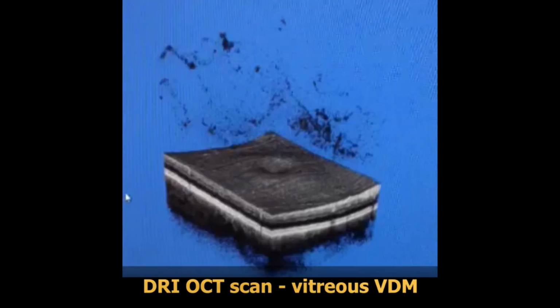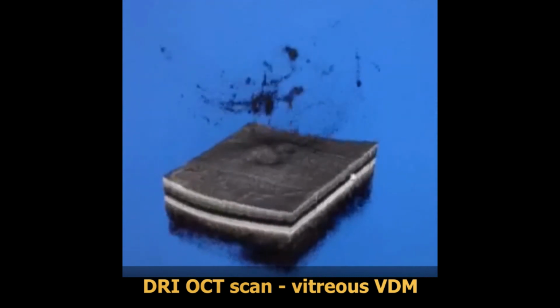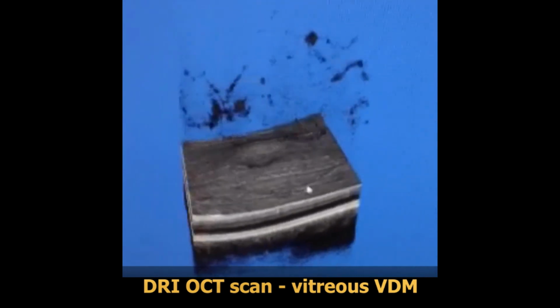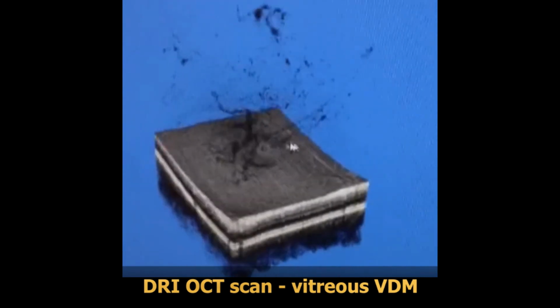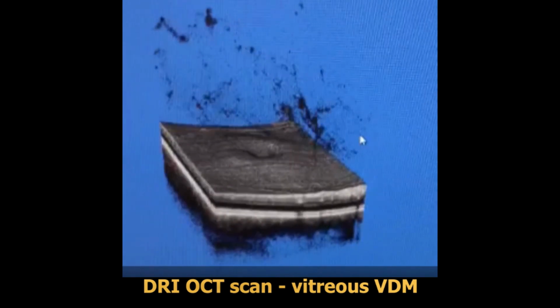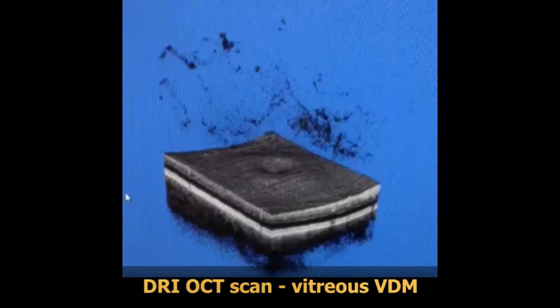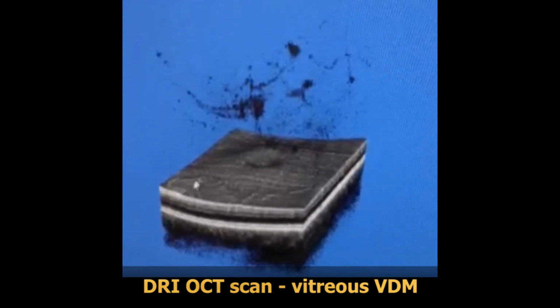When these floaters demonstrate structural abnormalities, such as the ones seen here, and are associated with visual dysfunction, in particular degradation of contrast sensitivity function, then the term to apply is vision-degrading myodesopsia. These are the types of patients who benefit from surgical intervention with limited vitrectomy, although other treatment modalities are being sought.